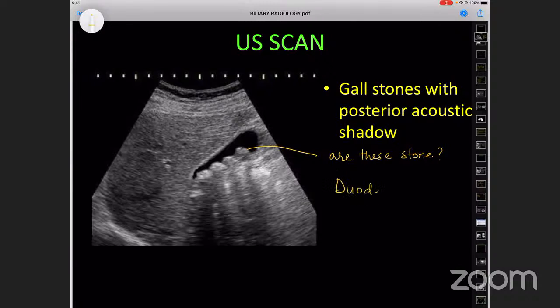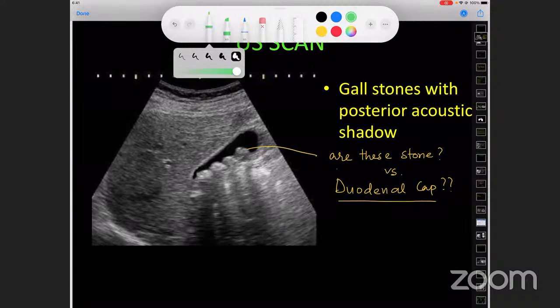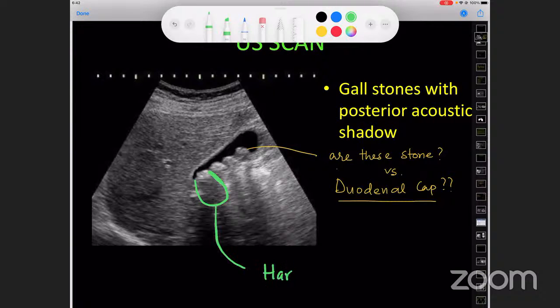Air is echo-opaque, and I'm sure Dr. Avik Bhattacharya is going to bear that out, which is why you will find the radiologist turning the patient from side to side. You see, the Hartmann pouch, or even the fundus, often sits very close to the duodenum. Now, if there is a fair bit of gas in the duodenum, you do get an acoustic shadow behind that. And I think Dr. Avik Bhattacharya will tell you the whole purpose of moving patients around is to move that duodenal gas shadow, if there is any, so that you unquestionably have an echogenic lesion and an acoustic shadow behind it.